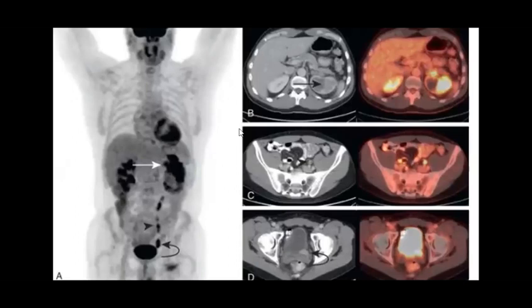That you find multiple lesions in the bladder and the ureters, and they like to mention this drop metastasis. Drop metastasis. Yes. So synchronous transitional cell carcinoma or multifocal transitional cell carcinoma.